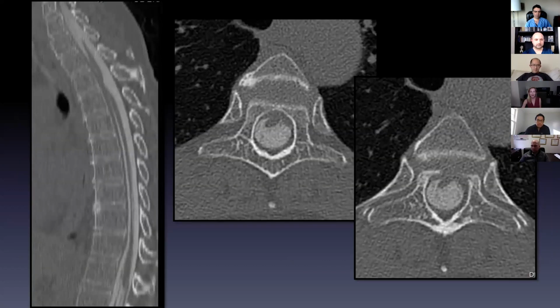Maybe in the interest of time, I will take it since we got a little bit of a late start. How about that? This is a myelogram, sagittal. I injected the contrast under fluoro, took him to CT. So this is all contrast. This is the spinal cord. Abnormal course of the spinal cord coming ventrally. The cord is very narrowed at this point as well. Is this a scalpel sign, or is it the smooth C sign that we saw from the arachnoid cyst? A little bit hard to tell.